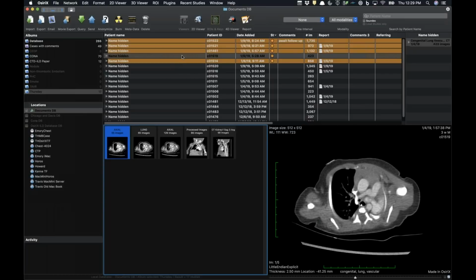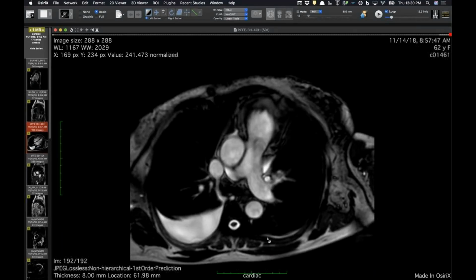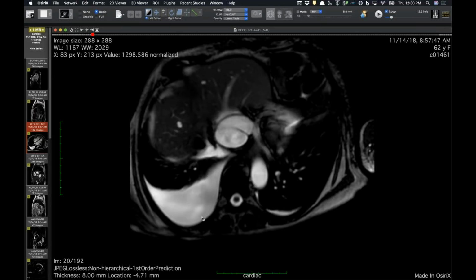Okay, then I've got a couple of cardiac cases. We've had a run on this diagnosis recently, and this is one of the better cases I've ever seen. This is a 62-year-old patient, and you'll see on the cines that she has a right-sided effusion and a small left effusion. She has large fibroids, had ascites as well, and was presumptively billed as just Meigs syndrome, since she had a big uterine fibroid and maybe ovarian masses too, and as a result ascites and right-sided effusion.